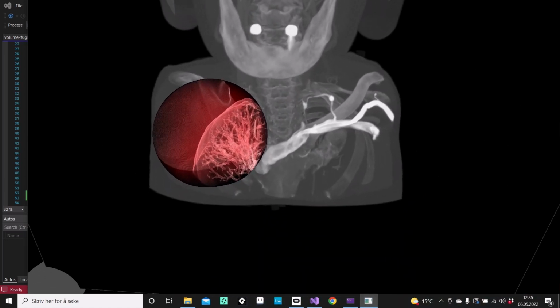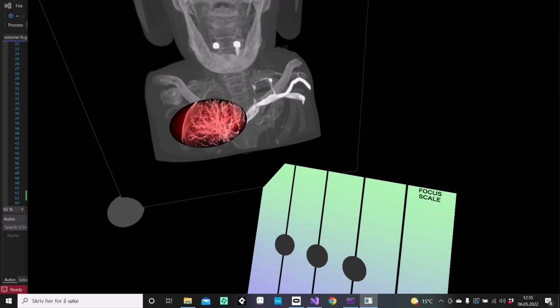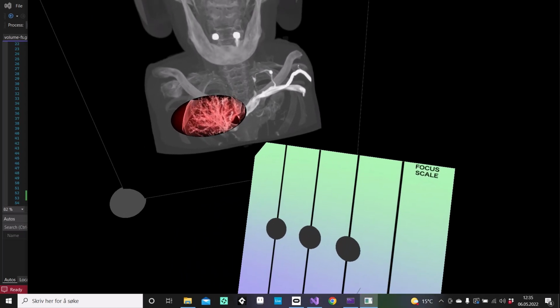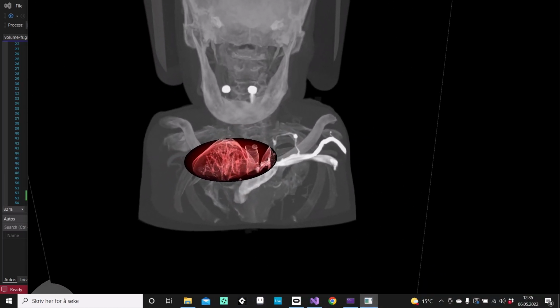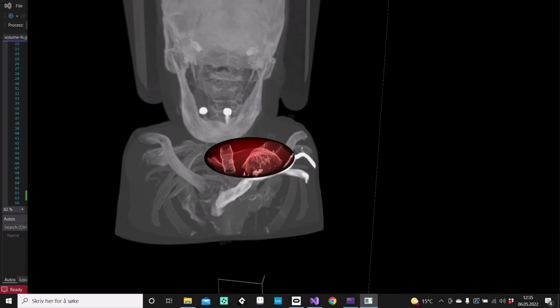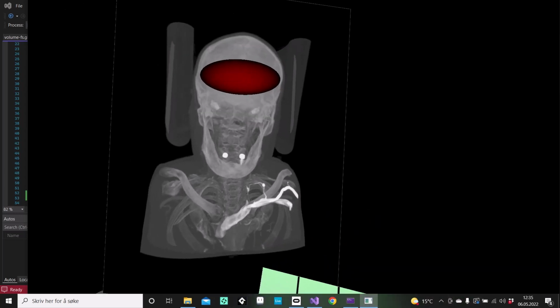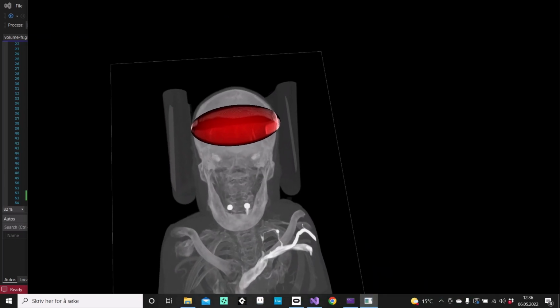Then you can shape the focus further by using its scale sliders. Maybe you want a flatter disc-like focus, for example, to scan up through the volume. The focus can also be used to cut away dense structures and let you view its inside without lowering the contrast with the density slider.